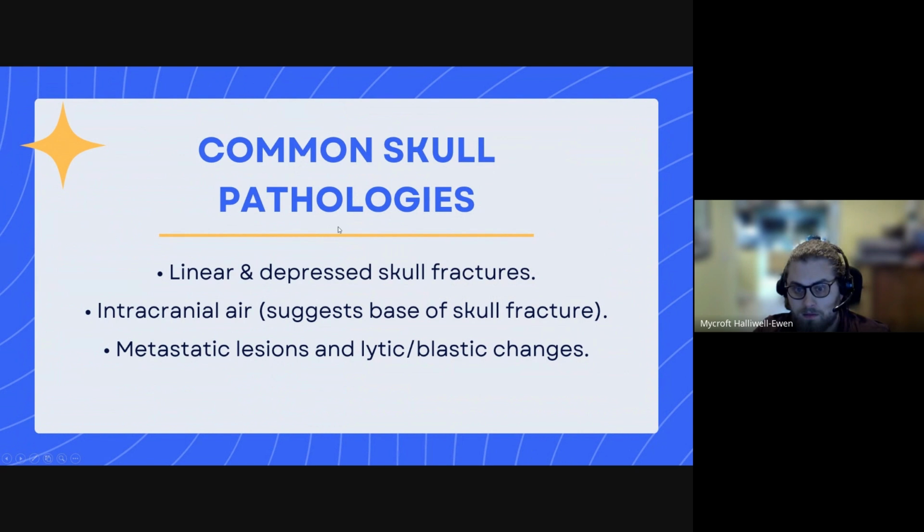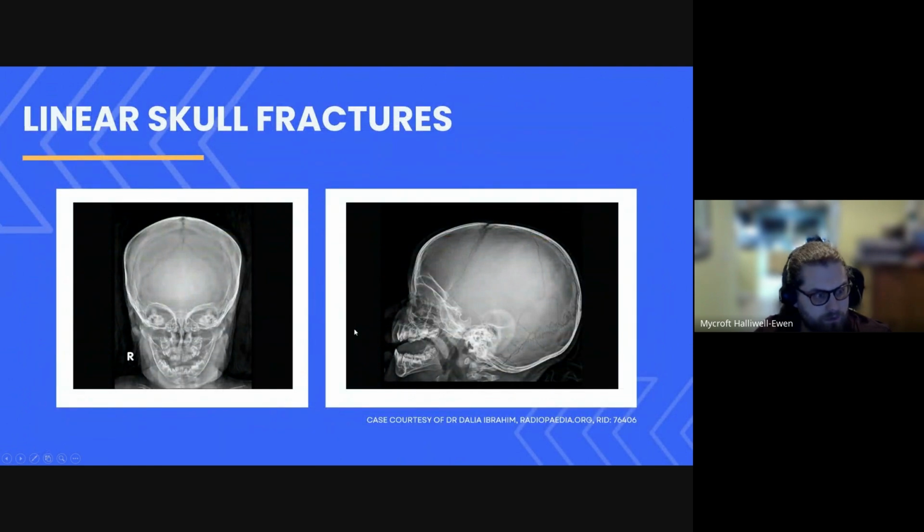Okay, let's go through some common pathologies. We'll see some skull fractures, some intracranial air, and then some skull lesions. But I think we should just crack on, to be honest. Okay, have a look at this. Take a minute and just have a think about what you can actually see.